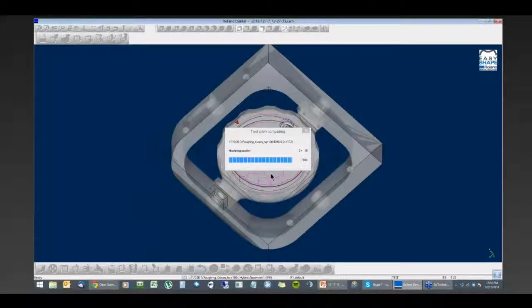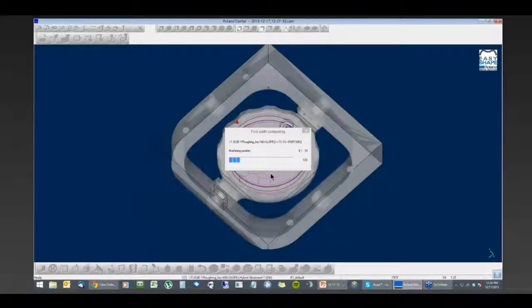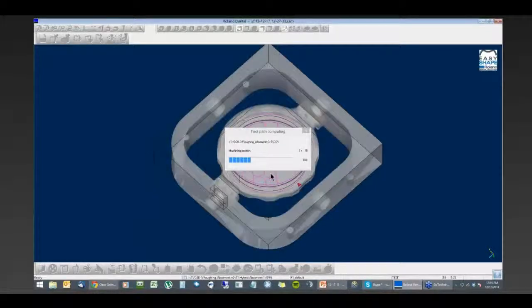Whenever you're milling a new object type in SUM3D, something that you've never milled before, especially if you're not sure that your reseller has provided it, after your calculation, instead of sending it directly to the machine, I would say no to that option, and then run through the simulation to make sure that it's cutting out correctly. This should be the general workflow whenever you're milling anything new, just to give it a check. Certainly it doesn't hurt to simulate after every run, but of course, in some production environments, we all know that may not necessarily be possible.